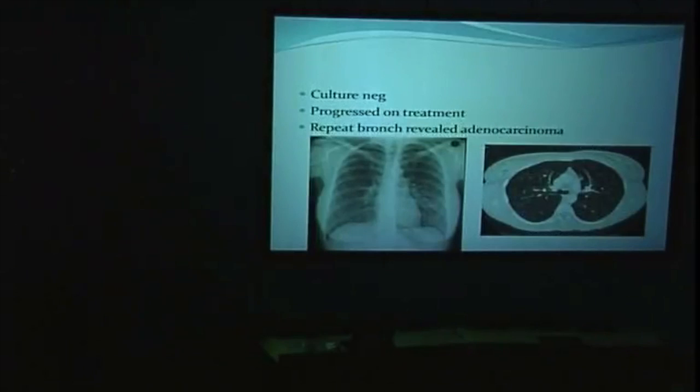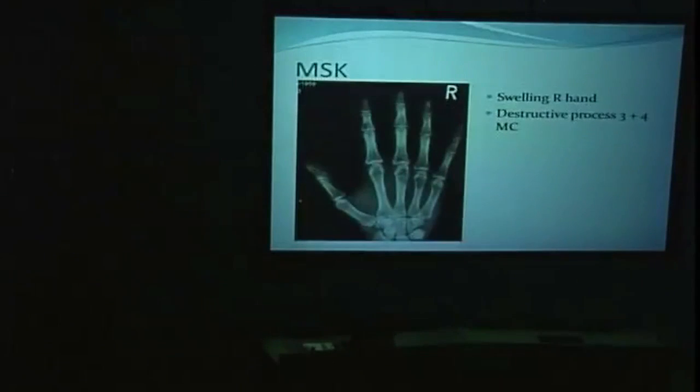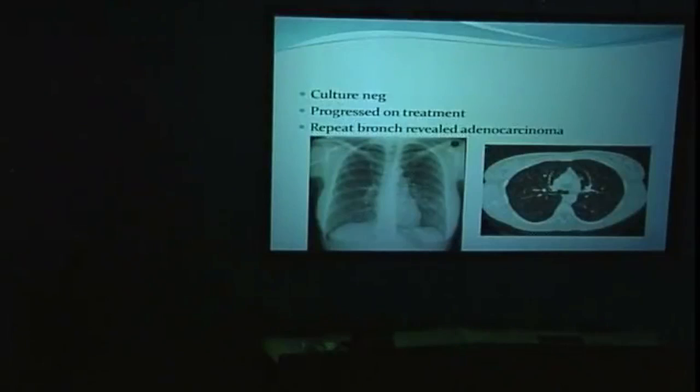Obviously, the CT didn't show any other abnormalities at that time, just this diffuse lung pattern. On repeat bronchoscopy, it turned out to be adenocarcinoma. So this was an adenocarcinoma of unknown primary presenting with a miliary pattern of deposits. Pattern recognition is all well and good, but remember your other causes of miliary disease. Typically it's breast; thyroid is the other one that often causes that pattern.